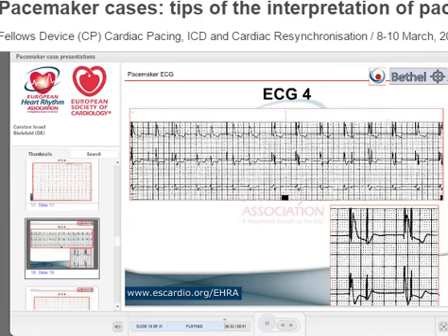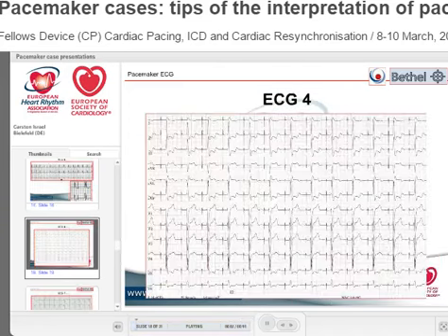So in AV junctional rhythm, you have very, very funny looking ECGs. But the patients maybe do not find this too funny. So the solution: increase beta blockers and increase the pacing rate to 80 beats per minute, overdrive the AV junctional rhythm, and you have a wonderful, absolutely normal ECG. Even no unnecessary ventricular pacing.